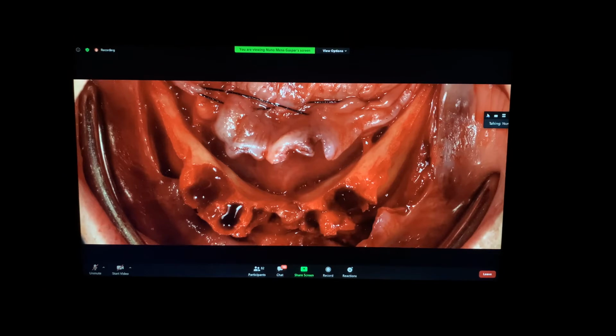This CT shows the mental nerve branch, okay, and this is another. So this gentleman had a mental nerve here with the branch lingual and the same here.